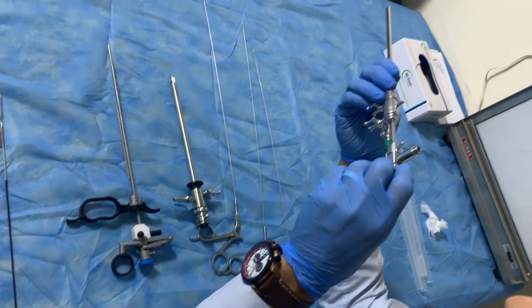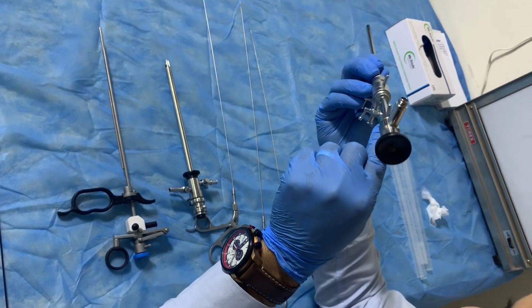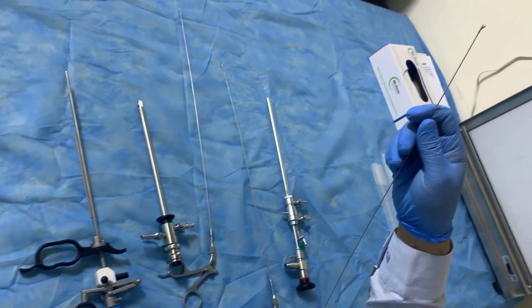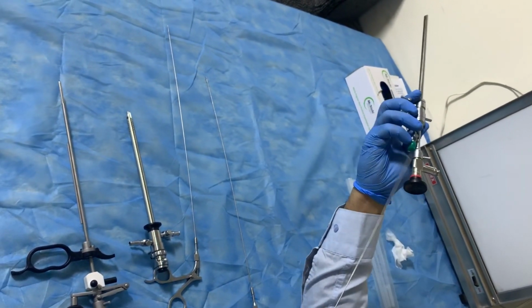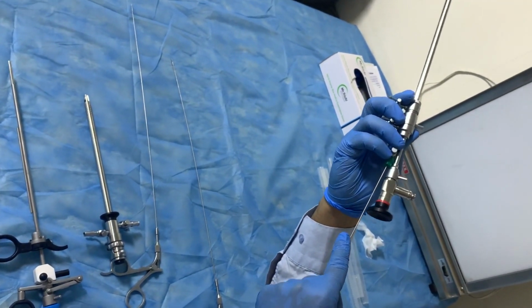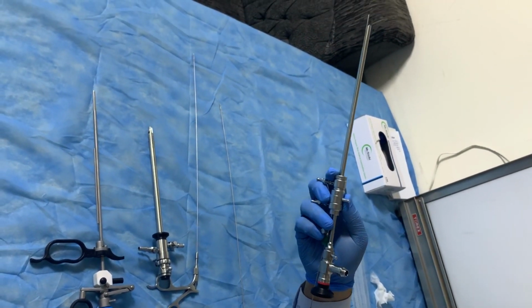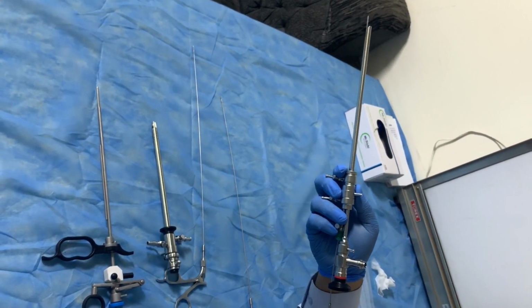This type of hysteroscope is also therapeutic because there is another channel here. Through this channel, we use another instrument like scissors or a grasper. This part is the scissor. We push this part from here, through this channel, inside. And slowly, watch it here. When there is a septum, we can cut it. When there is fibrous tissue inside the uterus, we can cut it, under vision.